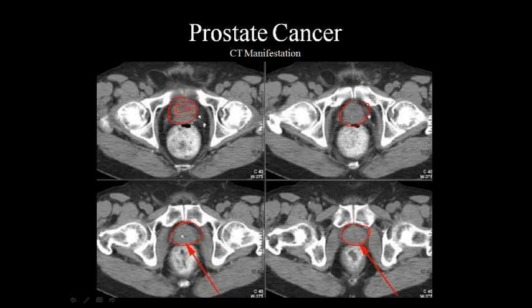That's typically what you're looking for, that hopefully will indicate some degree of mass, but you do see a prostatic calcification in this image. But in terms of whether this is benign or malignant, whether there's something going on or not, we really can't see.